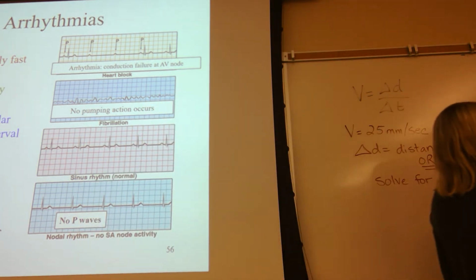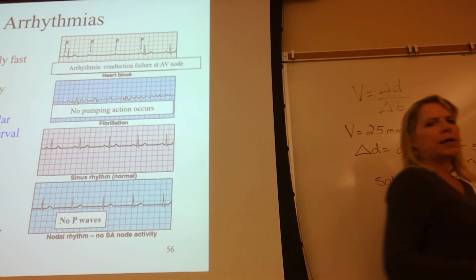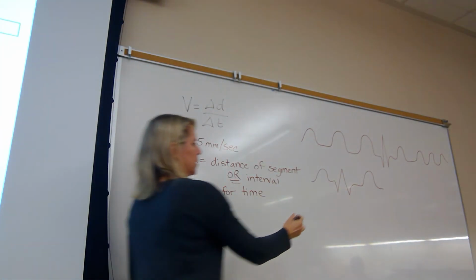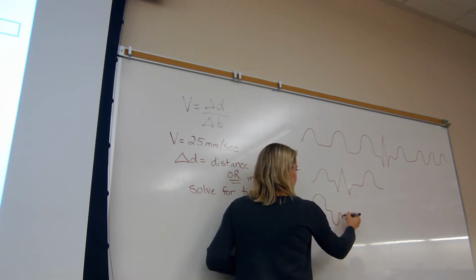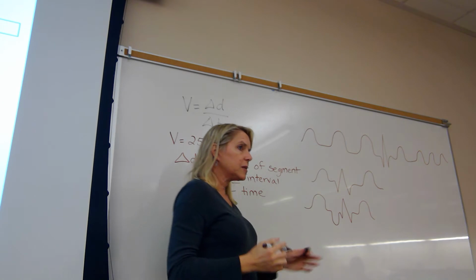How would our traditional EKG picture using lead 2 change if we saw atrial repolarization? Here's atrial depolarization. What would it look like? Would it look like this? And then we would get our QRST? Isn't that what we would see?